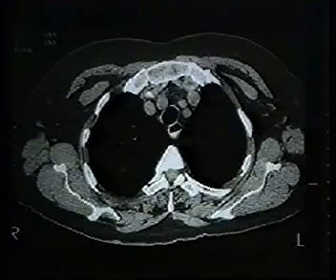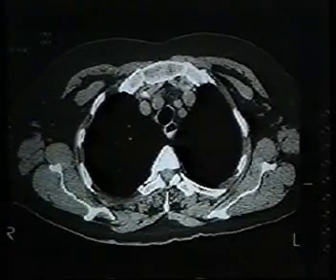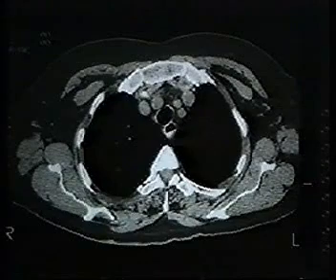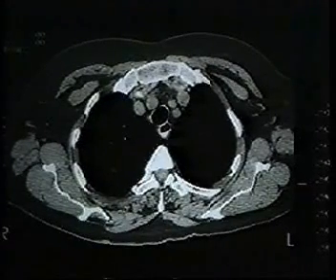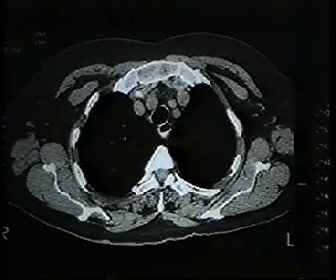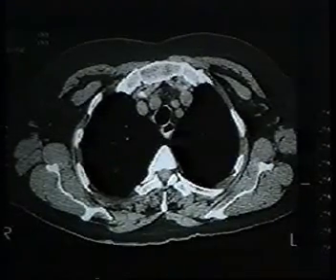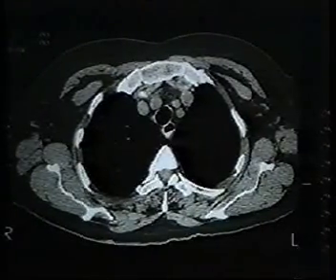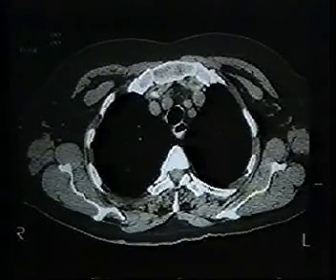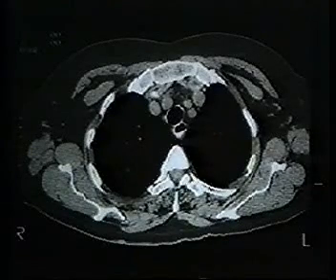If we measure CT numbers from this nodule, they are all in the minus 80s to minus 145, certainly in the range that we would consider to be diagnostic of fat. We do not have proof that this is a hamartoma. Hamartomas can present with an appearance of diffuse fat with no recognizable soft tissue within them. This was diagnosed as a benign lesion on CT and has been followed.